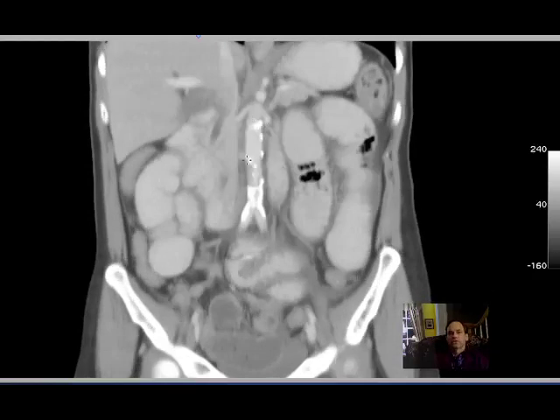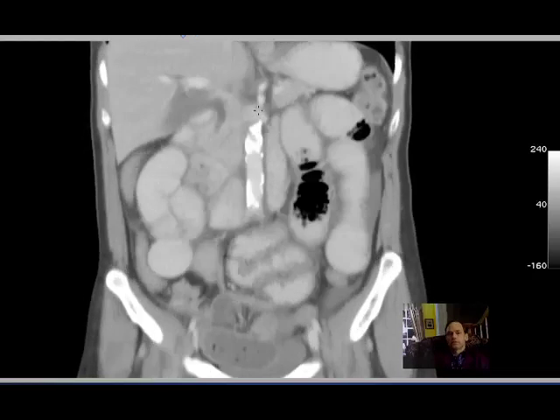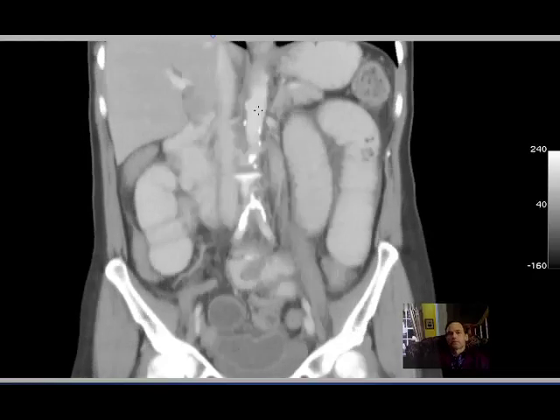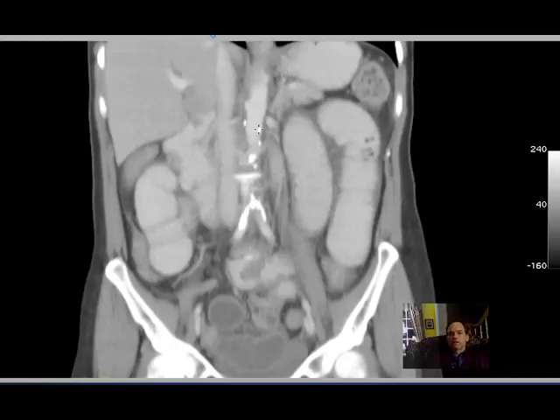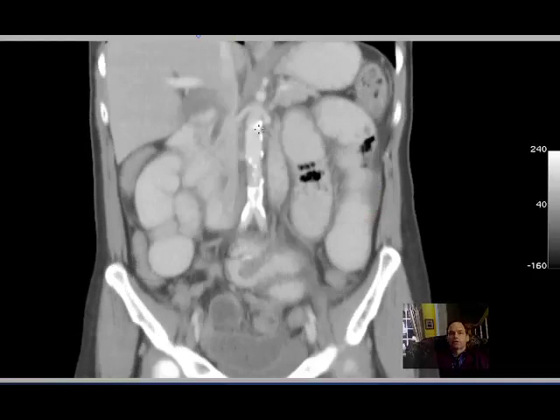Okay, so nice view of the abdominal aorta. And, well now, look at this. Here is the abdominal aorta, and let's come out anteriorly, one cut, and we have 1, 2, 3, 4. What are those vessels going to be? Well, this you would look at ordinarily and say, how can I tell?